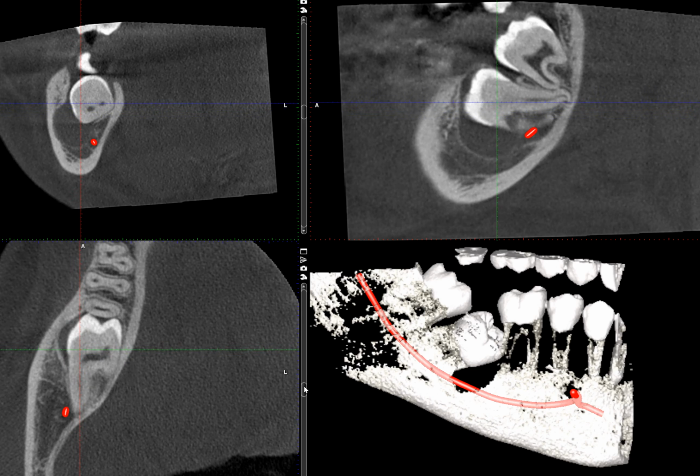Generally speaking, with most dentigerous cysts that I've seen, the expansion tends to occur right in the occlusal space, but in this case, probably due to its impaction and the fact that number 32 is preventing this tooth from moving posteriorly as the lesion is growing, it probably found that the path of least resistance was into the trabecular bone, hence it expanded into the trabecular bone instead.